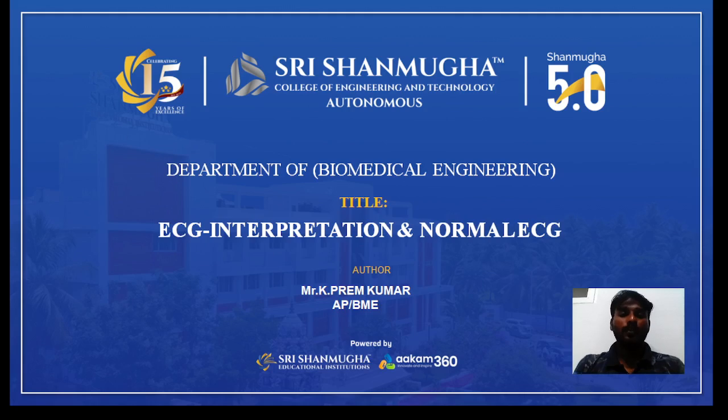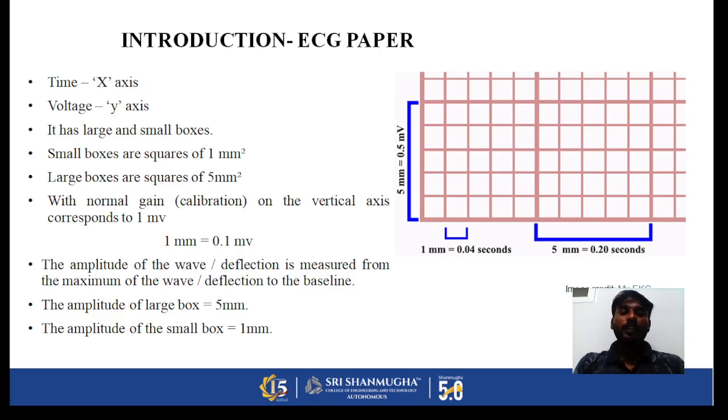Today we are going to discuss ECG interpretation and the normal ECG. Before getting into ECG interpretation, we should know about ECG paper. The ECG paper looks like a graph sheet, but it is a specialized graph sheet. It has the x-axis of time and the y-axis of voltage.